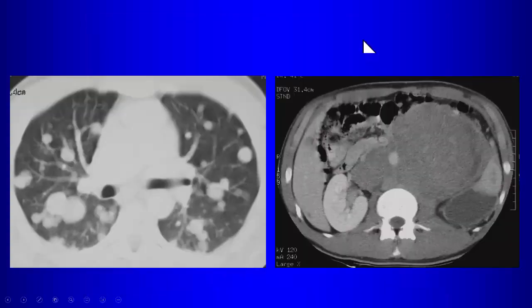And what is the finding here on the CT scan in the same patient? Yeah, there's a large retroperitoneal mass, and we have these nodules. So what is your differential diagnosis? How do you put these images together? What could these be? So lymphoma, that could be retroperitoneal lymphadenopathy. Lymphoma can give you retroperitoneal nodes and disease like that in the lungs.